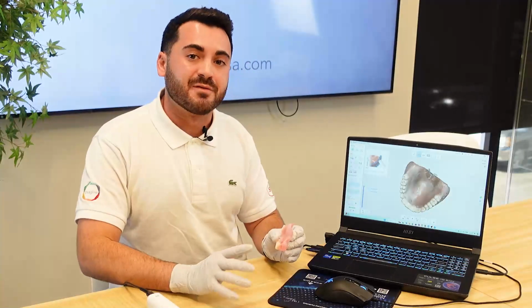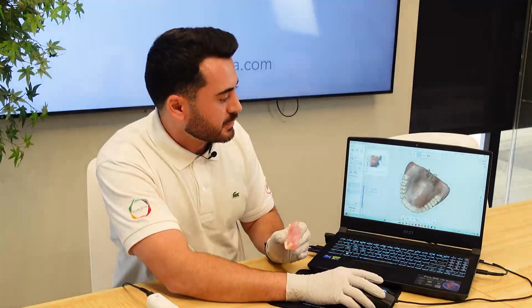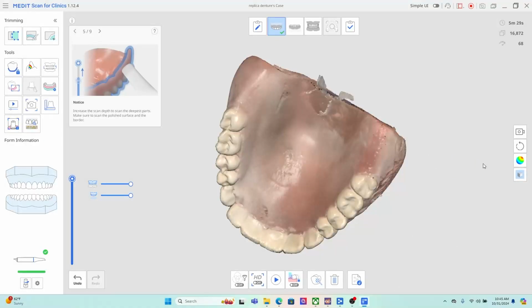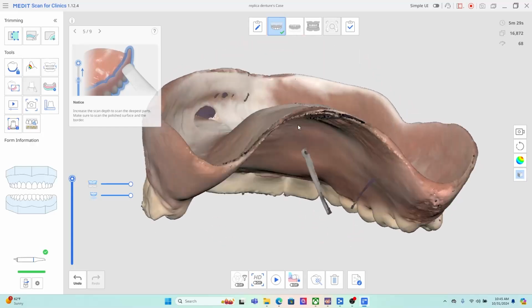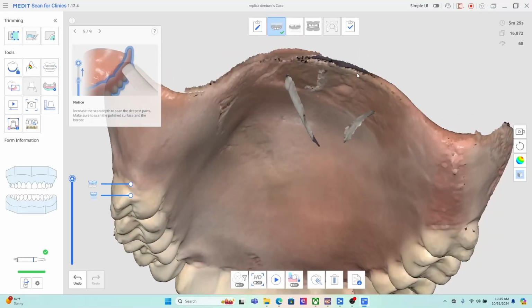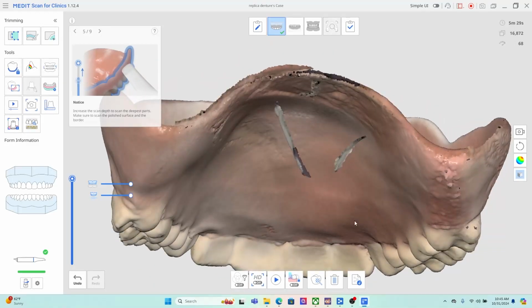In this case, if we have any areas of data that don't seem to line up properly, what we can do is first try to optimize. You can see near our palette area, we don't have the best stitching. It seems like we have a little bit of overlapping data. So what we can do is first select optimize down here on this bar.